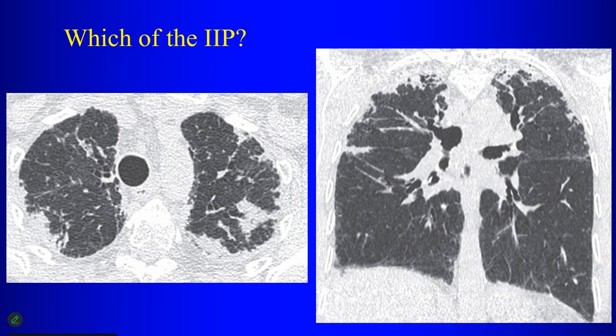Nodules, right? Silicosis has small nodules, right? That goes against silicosis. The disease, have we mentioned the disease yet? No. It's 4 letters. You want to mention the letters?